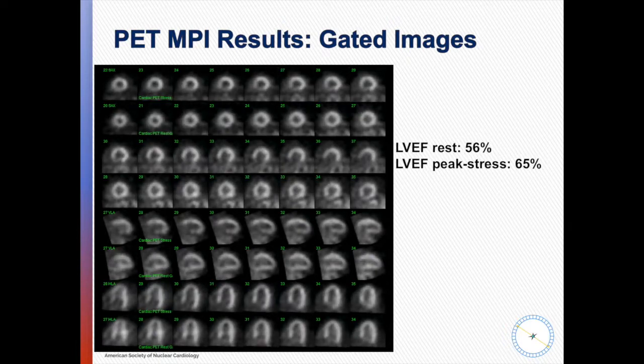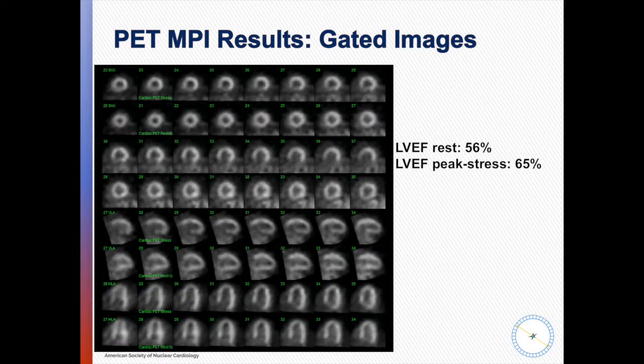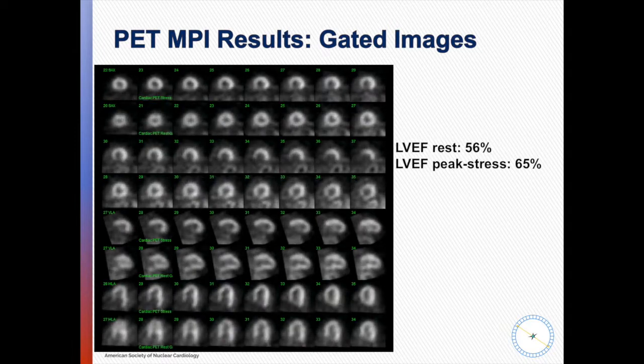So the fact that the ejection fraction has gone up has been shown in prior work to have high negative predictive value for the presence of severe angiographic disease, including left main artery vessel disease. Okay, but the fact that there is a change in the wall motion and the wall thickening inferiorly clearly tells us that there has to be a very high grade lesion in whatever artery is subtending that territory. I agree. Yeah. I agree.